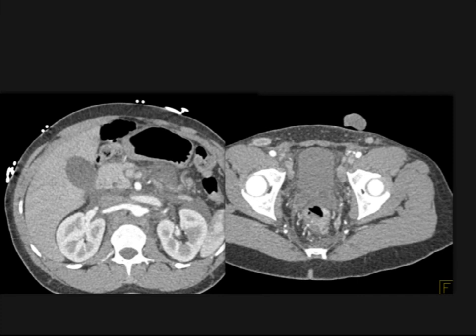If you said adenocarcinoma, I'd have a hard time saying you were wrong. If you said lymphoma, I guess lymphoma in the colon is uncommon, but you could be right. But I was pushing the HIV, and this indeed was Kaposi sarcoma. We did read it correctly.